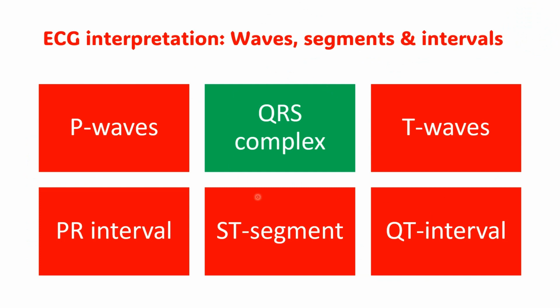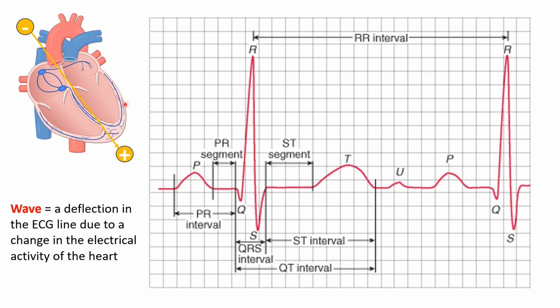Okay, so today we're going to be giving particular focus to the QRS complex. Before we get into the bulk of this video, if you haven't already seen my other videos in my ECG interpretation playlist, make sure to check them out before you watch this video. So here are some diagrams you might be familiar with.